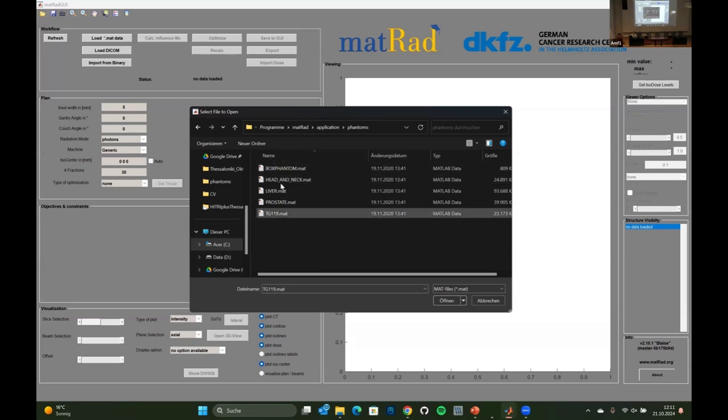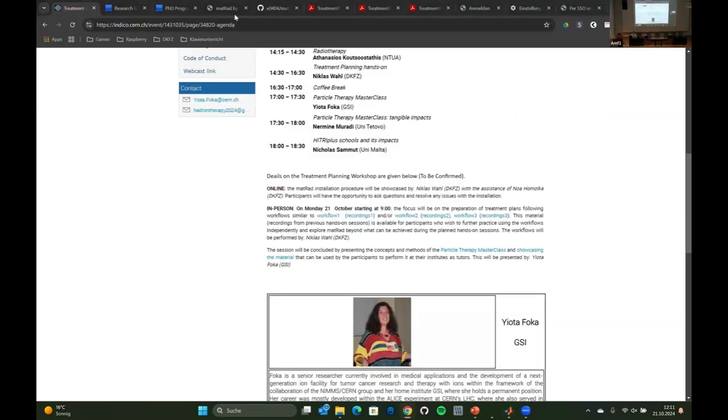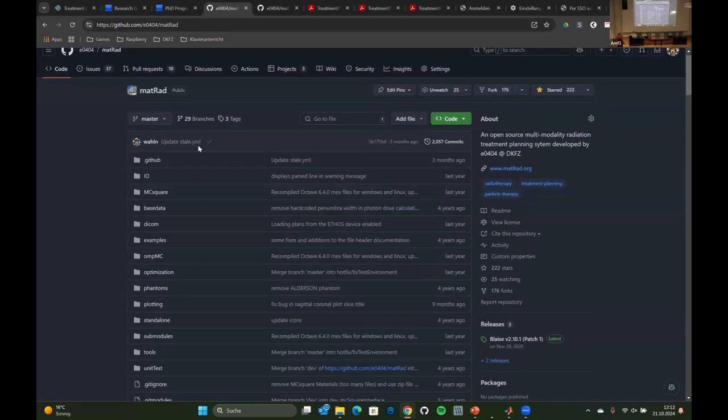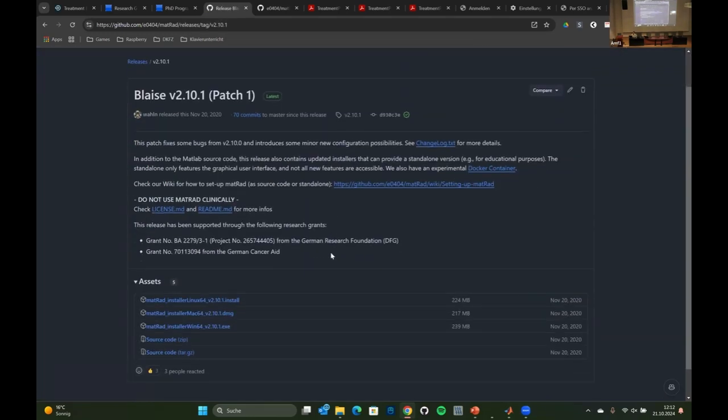It's a little bit difficult. If it is too difficult to locate them, there's a workaround. And this workaround is just, I show this very quickly, to go to our GitHub. So basically, this is the code. It's the same link kind of here where we had the release, right? This is the link that you find in the agenda or on this workshop website.